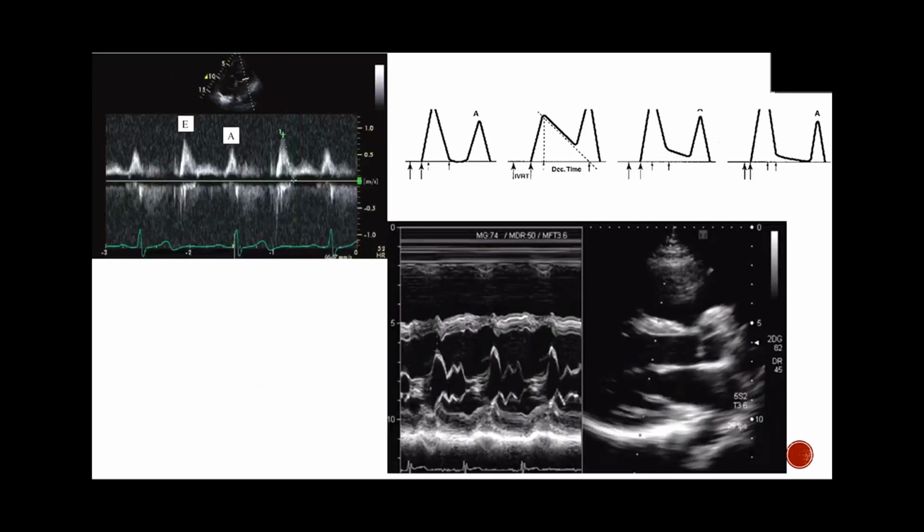All right. Now, it's not the exact same mechanism, but you remember in our M mode talk that we talked about that B bump, right? The little bump up of the mitral valve when you have high LV EDP. So I try to think of it in the same way. Well, it's not related to the same. It's just when that mitral valve should be closed, it pops back open again because of high left atrial pressures. Right, so think about them as very related.